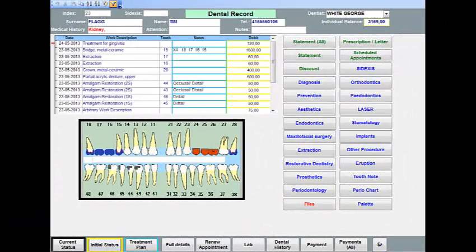All teeth have 2 general sections, the crown and the root. The palette is a graphical tool used to graphically set the crown and root of any tooth, whether primary or permanent.